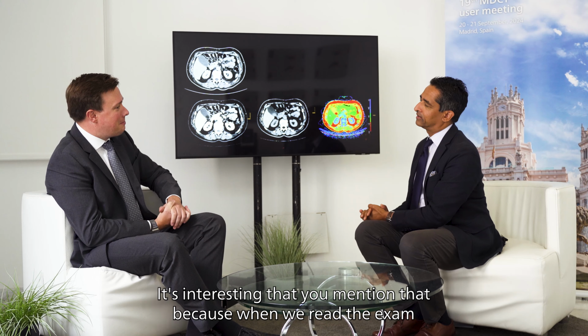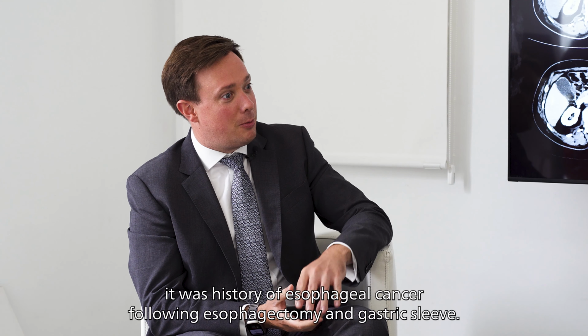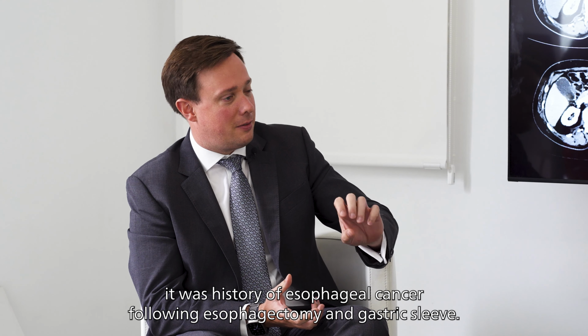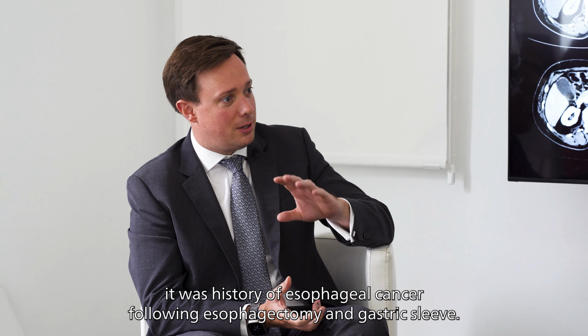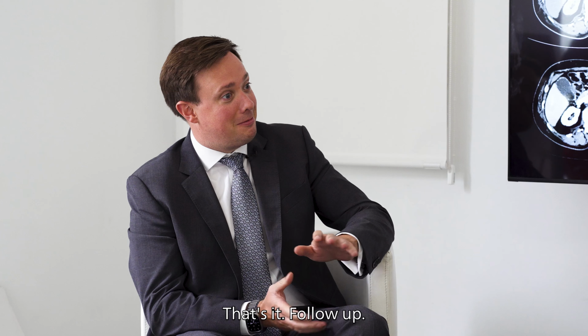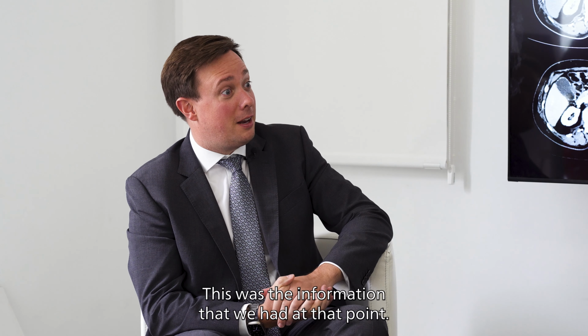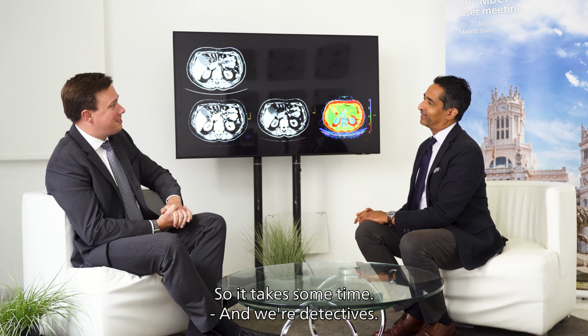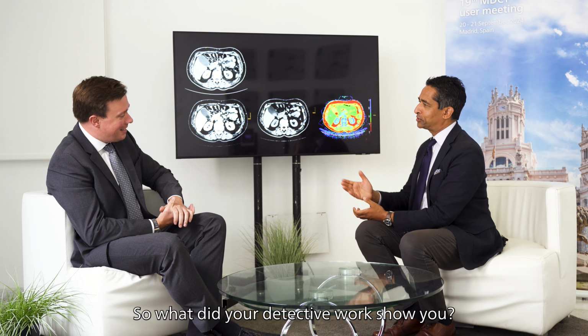That's interesting that you mentioned that, because when we read the exam, it was like history of upper GI of esophageal cancer following esophagectomy and gastric sleeve. That's it. Follow up. Okay. This was the information that we had at that point, because we always get very little information in these clinical histories. I mean, you have to put it in manually, right? So it takes some time. And we're detectives. So what did your detective work show you?